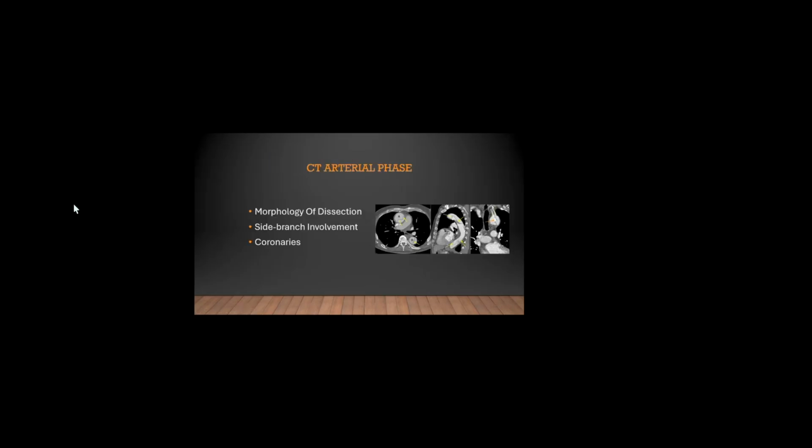That is the same image after giving the contrast, and we could see here the density that was seen on the non-contrast, and similarly, that was the crescent density, or the hematoma, in this scan.